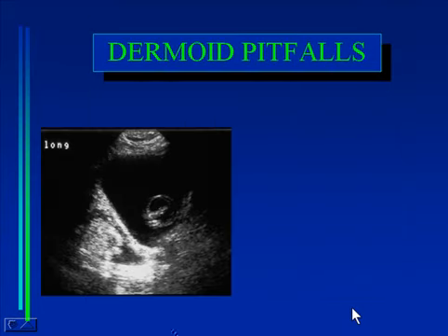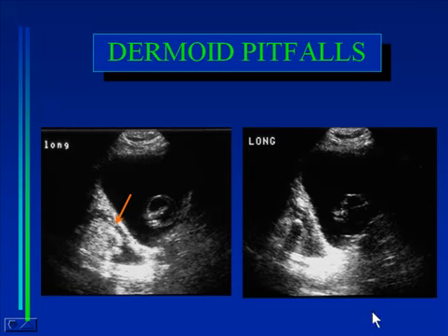How about abnormal bowel? Well, this was a case in which we felt rather confident that we had the diagnosis. This patient presented with right lower quadrant pain and had a highly echogenic focus in the right adnexal region. The echogenic focus seemed to be part of a larger mass, which was hypoechoic around the periphery of it. And the echogenic focus looked a lot like a dermoid plug, which is what we thought it was. And we thought we had really found the diagnosis then, when in addition to our dermoid plug candidate, we found a highly echogenic focus with posterior shadowing. That, we thought, might represent the calcification or the tooth within the dermoid. However, this proved not to be the case.